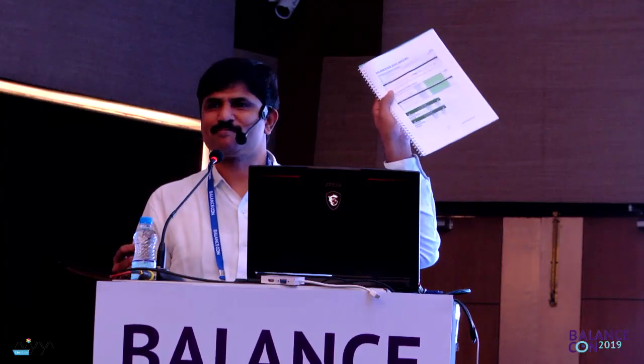So, fixation suppression of caloric nystagmus. There are two phases you can see. You can see something in gray and something in green. Can you see the markings?